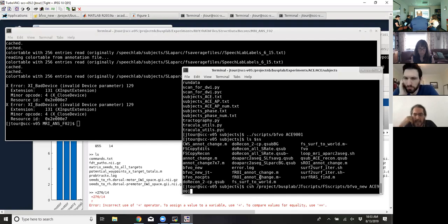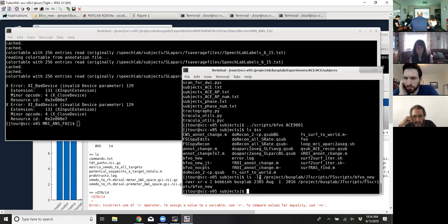So I was thinking it might be just because you don't have the run attribute, the execute attribute, as the third part of the listing. You do an ls minus al of the name of the file that you're trying to execute. The bfbo, yeah, new. Yeah, so you don't have the X. Oh yeah, you do have the X. So no, that's not it then.